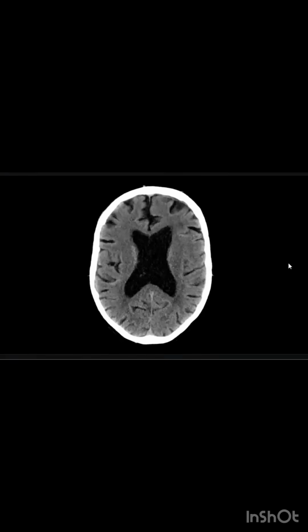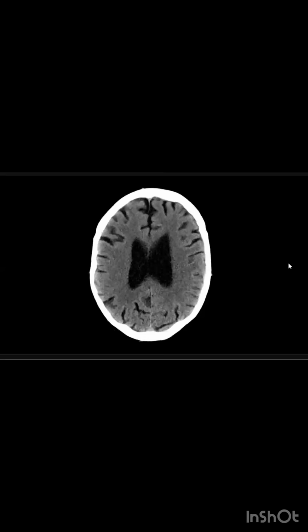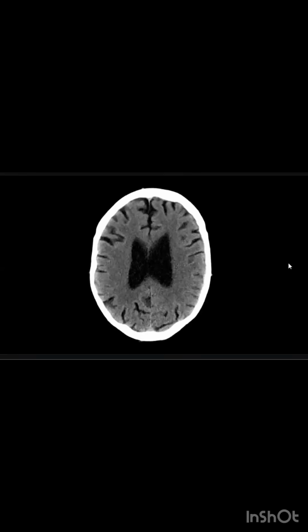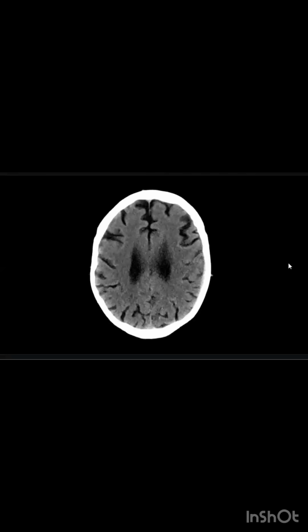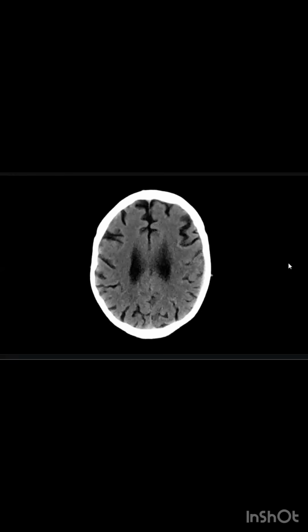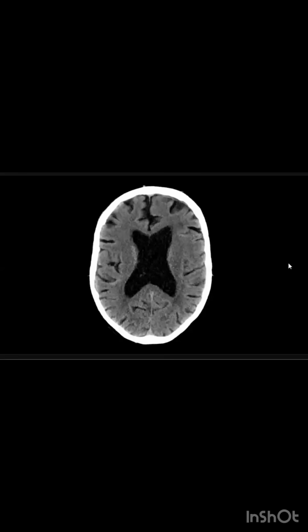However, as the patient has presented with altered consciousness, I would like to go for other check areas. Did you check the whole areas of the brain? Yes, as far as I think so. Tell me your check areas in the CT brain, please.